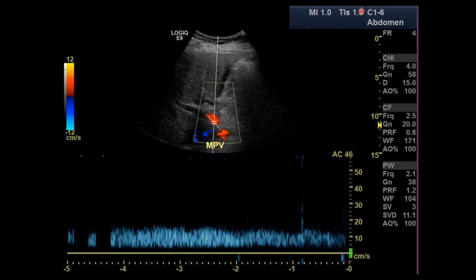In this video, I'm going to focus on the components of the ultrasound image where it refers to the MI and the TI, as well as the description of the probe here. MI refers to mechanical index. The MI is a measure of the potential for mechanical effects such as cavitation, which can occur when ultrasound waves create bubbles in tissues. So the mechanical index is primarily based on the peak negative pressure of the ultrasound wave and the frequency of the ultrasound. It gives us an indication of the likelihood of cavitation occurring.